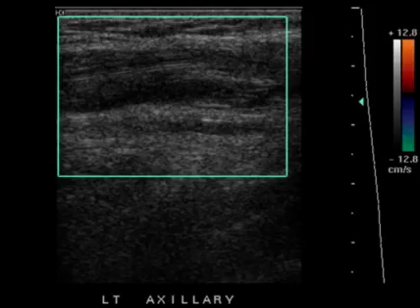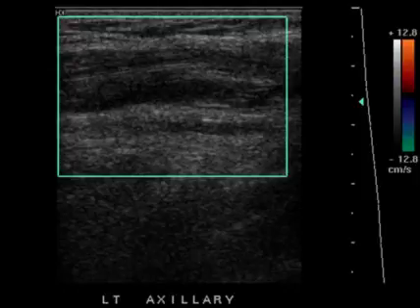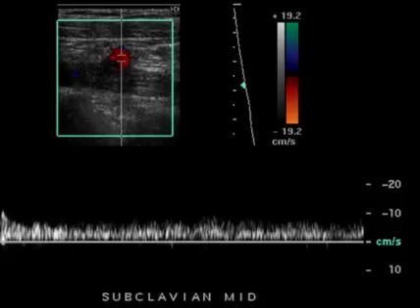We have largely come away from performing venography unless intervention is being contemplated, but certainly venography was quite commonly performed in the old days. At this point, I think between ultrasound and MRV, we've largely replaced it. Again, as I mentioned earlier, you may actually find these vessels are expanded and are traversed by a catheter, which is probably the root of the thrombosis itself.